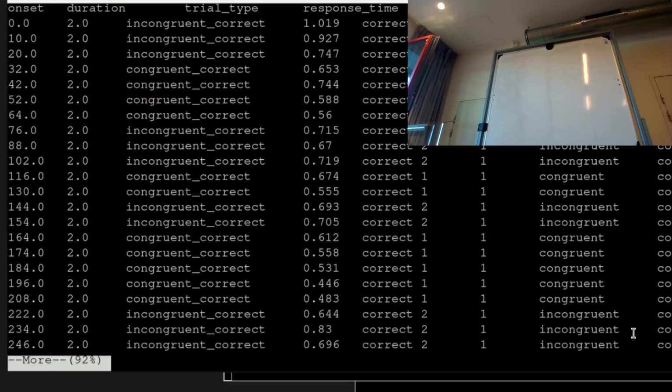You have the onset and the duration of all the stimuli during the scan, the response time, and whether it is correct or incorrect, if the subject made a mistake. Let's forget about the rest. Make sense?